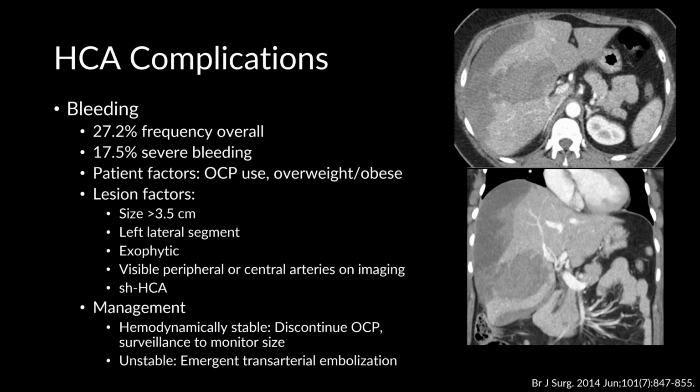As far as management, if the patient is hemodynamically stable, the patient should be counseled to discontinue their OCP use and should be surveyed for monitoring the size of the lesion. If the patient is unstable, then they are emergently embolized. And this is an example of a large bleed requiring embolization. It all remains subcapsular though, and she was monitored after embolization and did well.